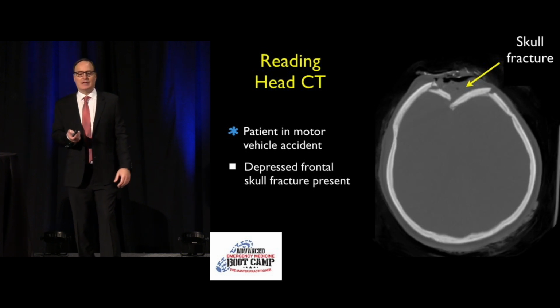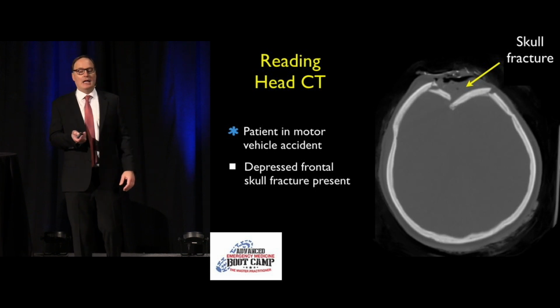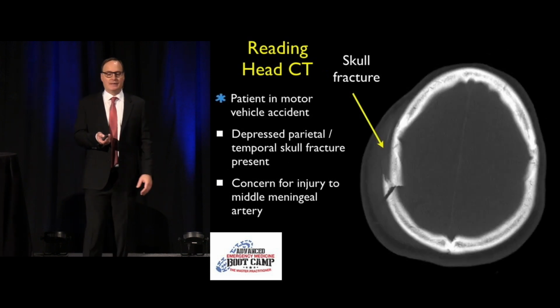The first thing is just looking for the skull fracture and making sure that you do look in a methodical pattern. I like to really look first through the skull windows.